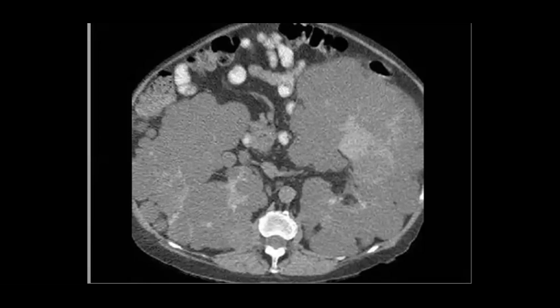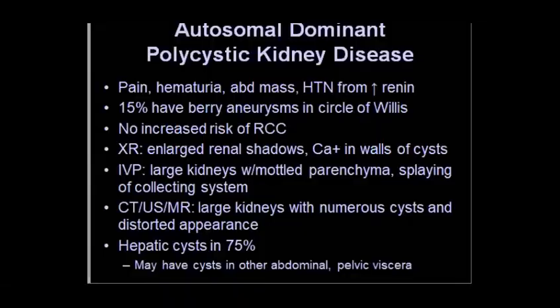Yes, okay. So what do you expect in the brain? This is an MCQ question. They like it: berry aneurysm. How much percentage maybe? If someone knows, it is about 15%. Nice. And sure, if you go to the liver, you can see some cysts, in the pancreas as well. So this is what's called adult polycystic kidney.